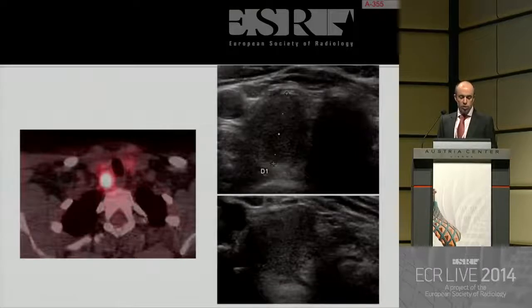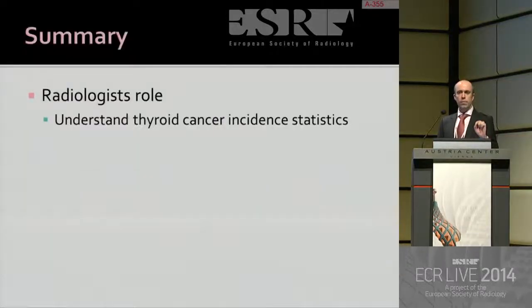Recent case from our institution, and this is what I mean by focal activity in the right lobe of the thyroid. Ultrasound shows a solid hypoechoic nodule, taller than wide. FNA was Thy 5, and it was a papillary cancer, not microcarcinoma, on pathology. So we need to follow these up if there isn't progressive malignancy elsewhere.